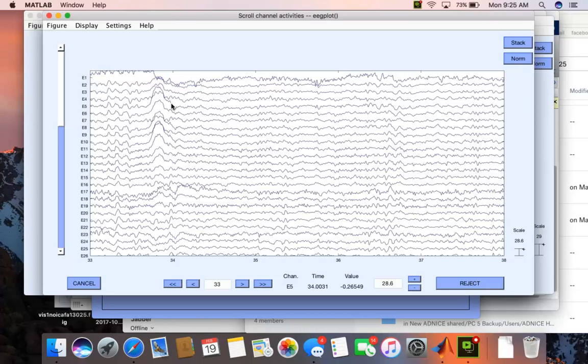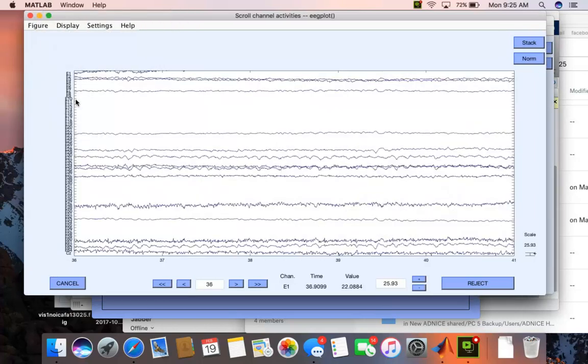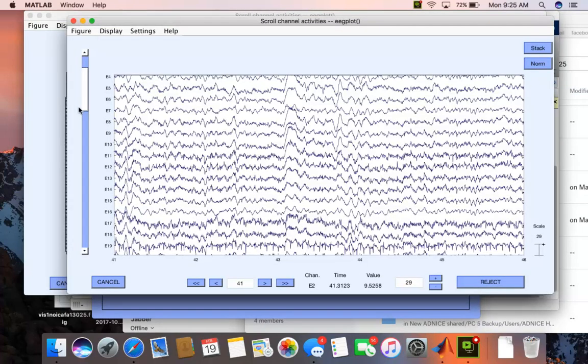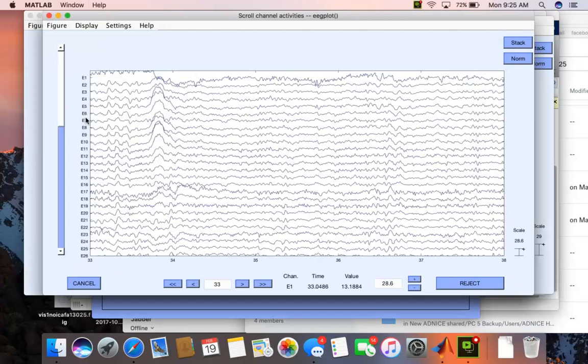But it's not bad. As you can see, just the simple filtering that we've done took us from, let me see if I can find that original data. Okay, it took us from this to this, which removes the DC component, to this, which removes some of the higher frequency components.